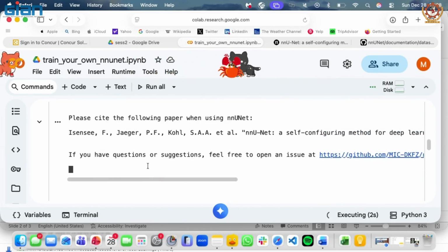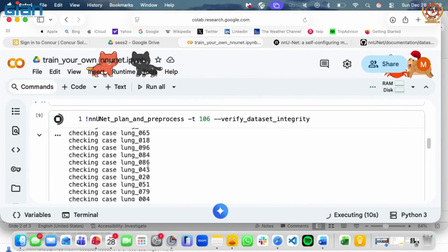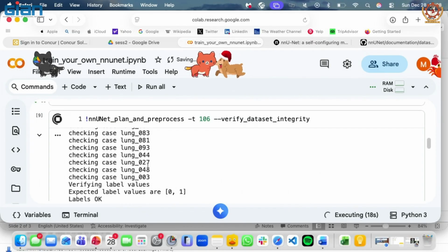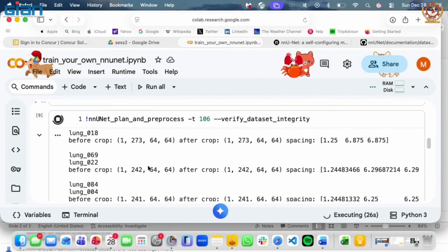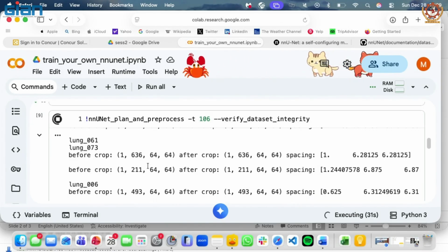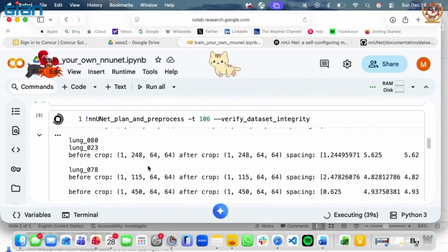What this will do is automatically pre-process the data. You remember yesterday we were talking about normalization, bringing the pixel values up to some range, multiple things. You don't have to do that anymore. nnU-Net automates everything. nnU-Net is, I would say, particularly built for clinicians who want to use segmentations but don't want to write code. They don't have the time or bandwidth or the interest in writing this dense normalization and pre-processing code, so it's very useful for them. Just keep the images and the labels in that particular file format, run this command, have a good GPU, start your segmentation training, and it's very accurate.